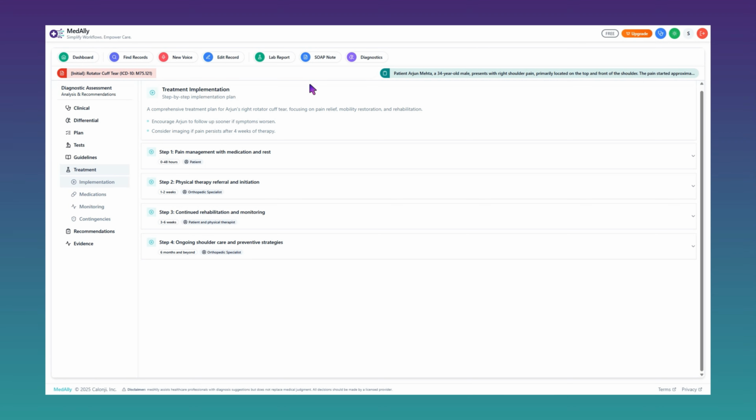Hi there. In this video, we will take you step by step through the MedAlly Diagnostix module.